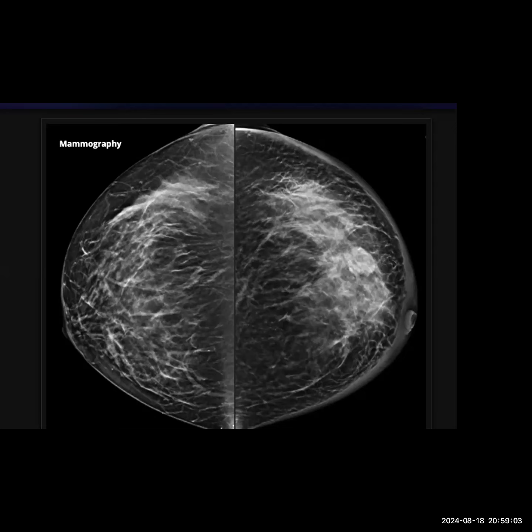I can see that there is also evidence of significant skin thickening in the left breast associated with thickening of the nipple. I don't see any obvious puckering or skin retraction. So I think this is a suspicious mass. I'm giving this an M4. I would convey this finding to the referring clinician, and this patient needs a referral to the one-stop breast clinic.